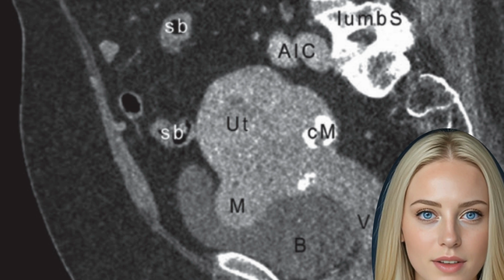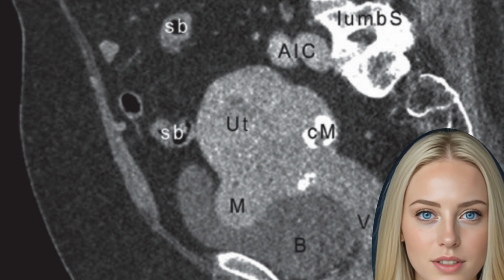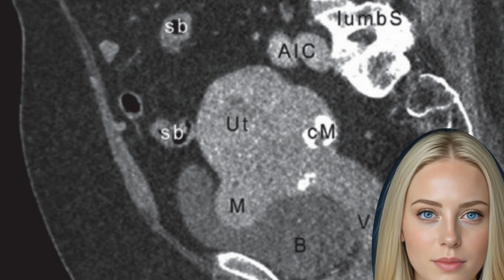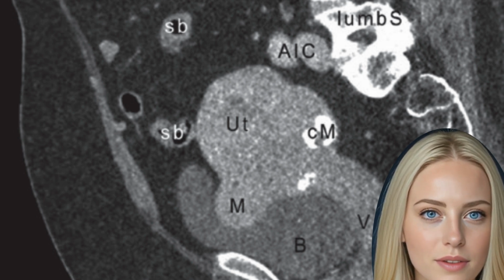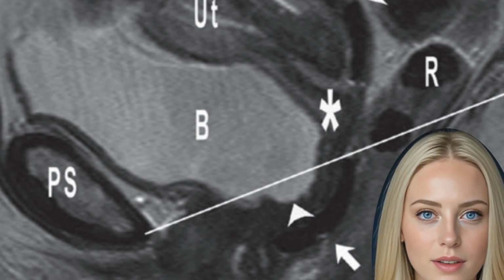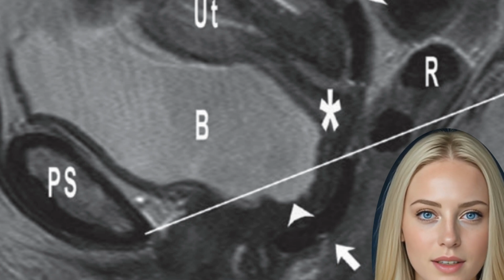with 94%. Fistulas. Vaginal fistulas may commonly occur after surgery, hysterectomy, radiation therapy, or with the background of chronic inflammatory disease. Surgical reconstruction of such fistulas may be challenging, wherefore the detection and exact location of the fistula is crucial for therapy planning. With thin-sliced T2 weighted or PD images with fat saturation angulated to the vaginal cavity, the fistula presents hyperintense and is commonly well delineable to the surrounding tissue.